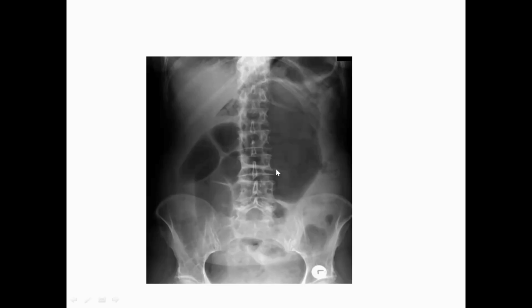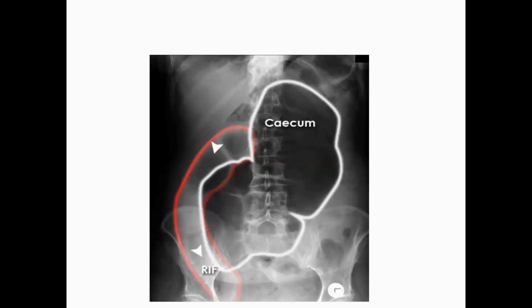Yeah, so this patient, it was only confirmed as cecal volvulus after going to the theater and during the laparotomy. But before, it only said that there was a large bowel obstruction. This is the same picture that has been traced just for you to know.